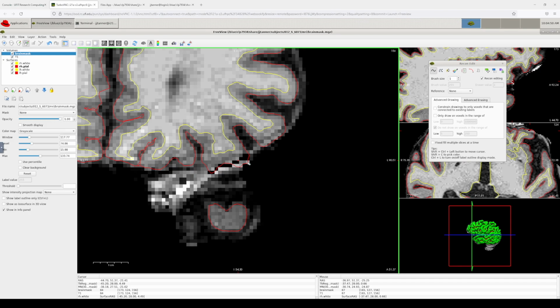You don't necessarily have to worry about deleting everything. Often it's just enough to delete a little bit out, so when you reprocess, it'll pull in this red line, this cortical surface. And then here, I'm going to delete that layer right there. And so really, again, I would zoom out and I would do this everywhere on this slice, the other hemisphere of the brain, all around. Do this everywhere that it needs to be done.